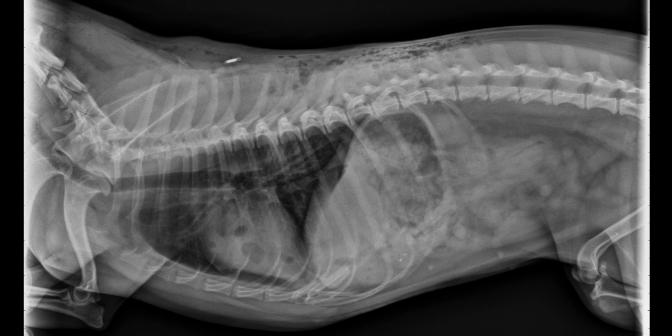I'm Amy Zalcman, your radiologist on demand for this week. Today we are looking at a 1-year-old female entire small mixed breed dog who had the misfortune of being attacked by a pit bull approximately 30 minutes ago. Although previously healthy, there is now tissue protruding from some of the bite wounds.